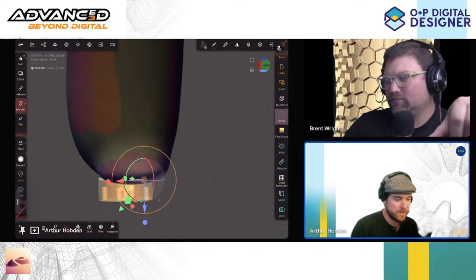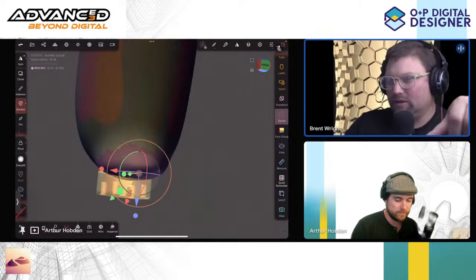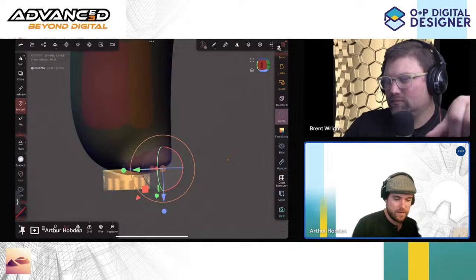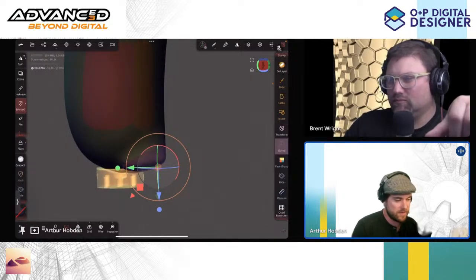Like that. And then looking at it from the front, you might do a one-dimensional. Would you go in at all, or would you want to keep that width? Yeah, I would keep the width. Yeah. Okay. Something like that. Cool. All right, so let's call that one done.